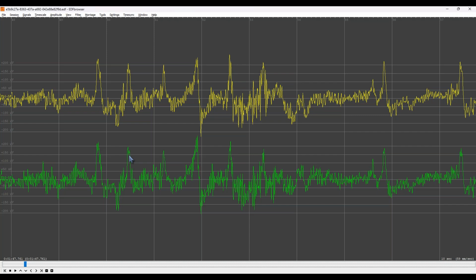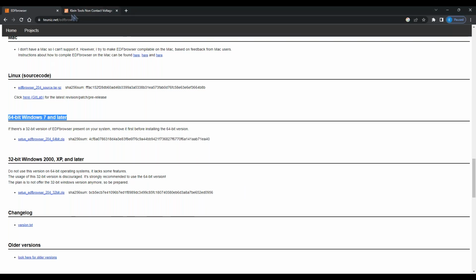Now, as far as a brain map's concerned, you could also look at it in our EEG edit tool. But in the EDF browser, the lines are a lot more sensitive than what you would see in our edit tool. So I like the EDF browser for just reviewing the recordings, but I have used our edit tool as well. I'll take a file that has artifact in it and plug it in there just so I can see it all.